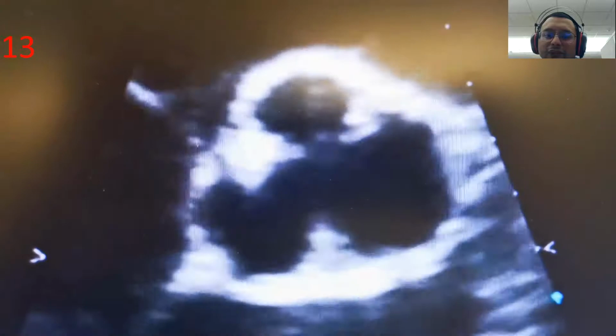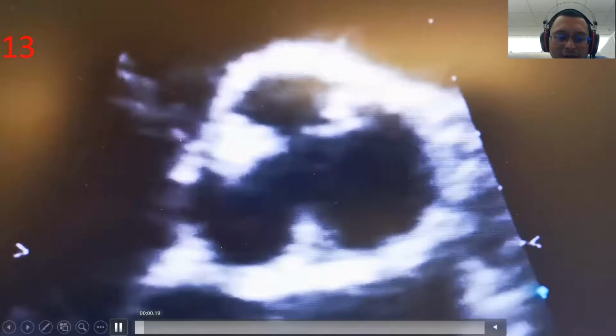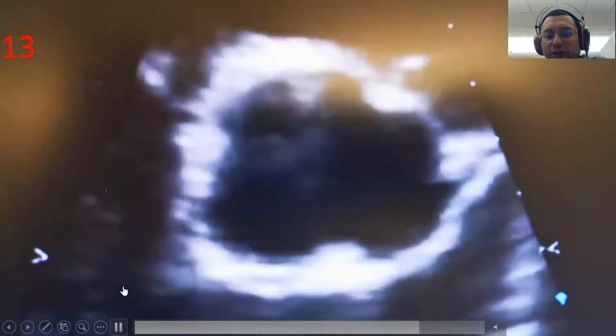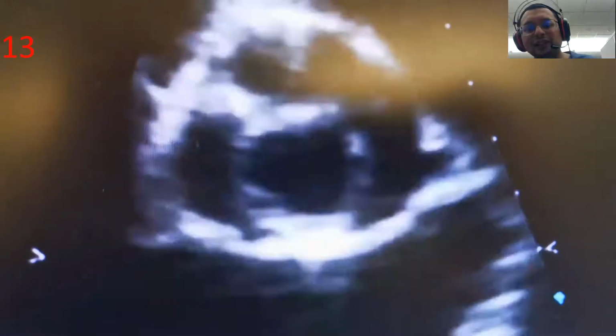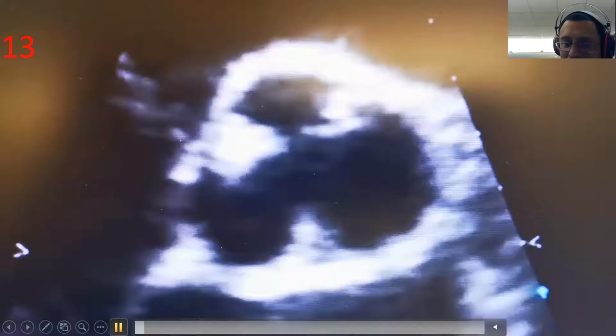Vegetation. No, look properly at how the aortic valve opens. Oh, is that a windsock? No. Look at the aortic valve. There are a lot of different diagnoses. The one that doesn't exist. So what is the diagnosis? What kind of valve is this? Quadricuspid. No.